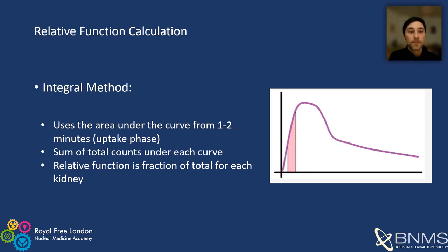for each kidney. The integral method is accurate and easily reproducible between operators, and the time points can be adjusted in the case of early or delayed start time.